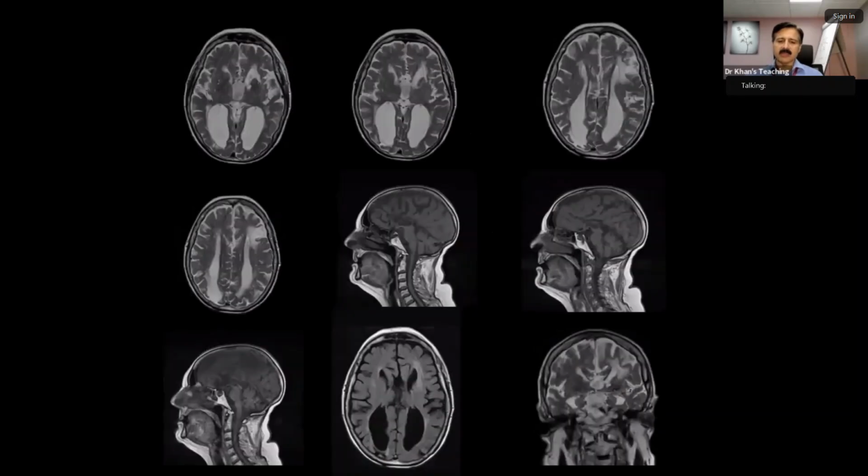And this is a 73-year-old. And if you see the MR, there was a bit of, I should use the word, dysgenesis because part, anteriorly, is atrophic, but it is there. But the main thing to learn is that they will show you in an axial slice in the exam, axial CT or an axial MR.